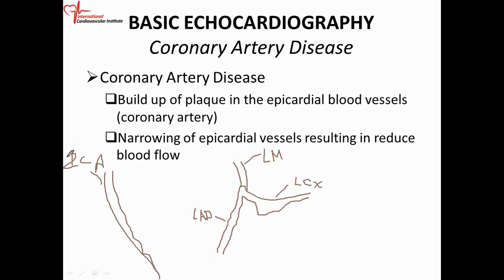So the pen, so this is supposed to be a hard sign. This pen doesn't want to work today. So it's the right coronary artery, RCA.